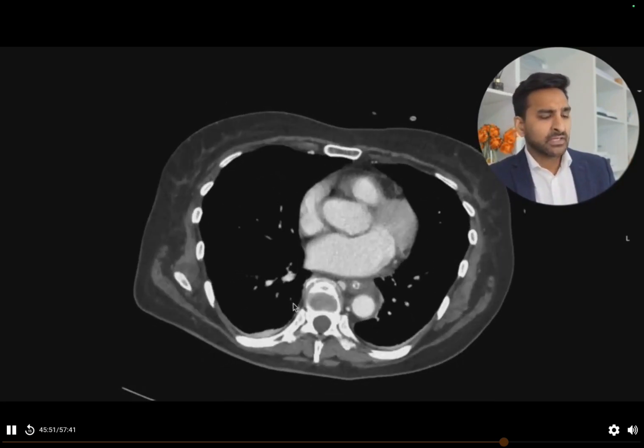Right, we have been through quite a few cases, and I really hope that that's been useful. At the very least, I've given you entertainment, because those of you that do radiology, enjoy radiology, or are interested in radiology, may enjoy just going through cases. I mean, going through cases is good fun. Also, it may give you a few check areas, a few things to think about when you are going through your imaging and going through your own practice. I would highly recommend doing the MIPs on the MPRs, using the MPRs, and definitely checking every single window that you can. And lung windows aren't just looking for lungs, you know, they can pick up some really interesting findings. And over the years, it's got me out of a few difficult situations.